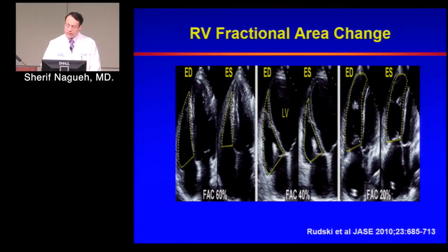Then come the questions of how well we see the endocardium in these views. If you end up with images like these, it's not a challenge, but more challenging images are the ones that cause problems.